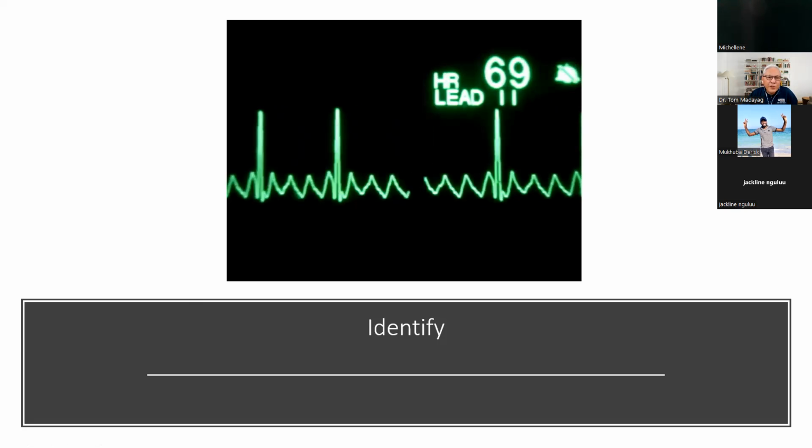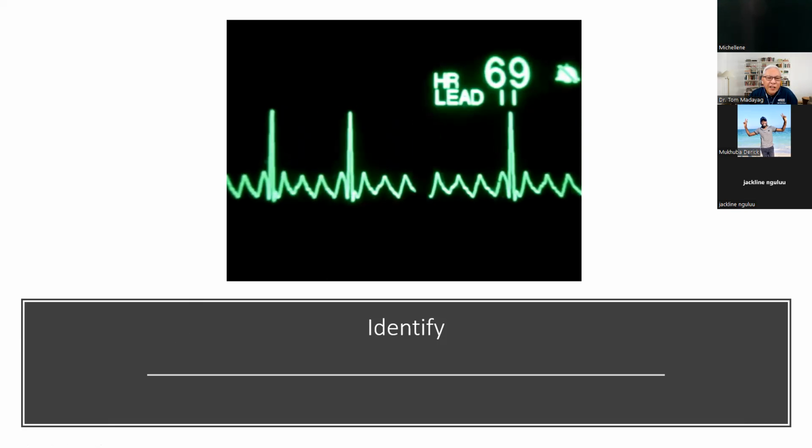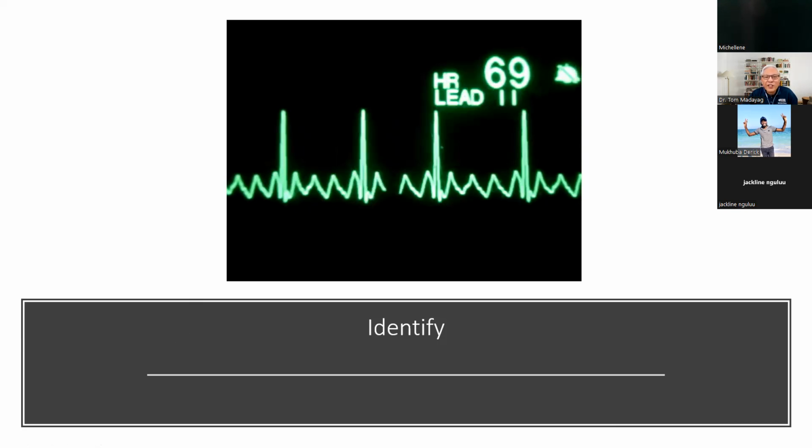Some of you answered atrial fibrillation, some of you answered atrial flutter, and some of you answered junctional tachycardia. So let's go ahead and look at the correct answer. The correct answer here is atrial flutter.